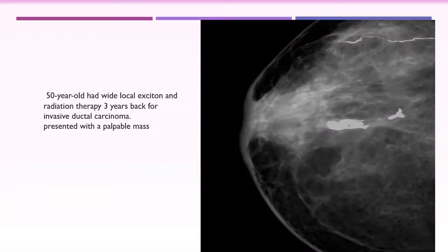What is the cause of these densities? Could it be calcification at the site of the surgical clips? Yes. What is the type of calcification? Yes, you are right, these are calcifications. Is it suspicious calcification? It is junk calcification. It looks benign. Yes, it is junk calcification, benign.